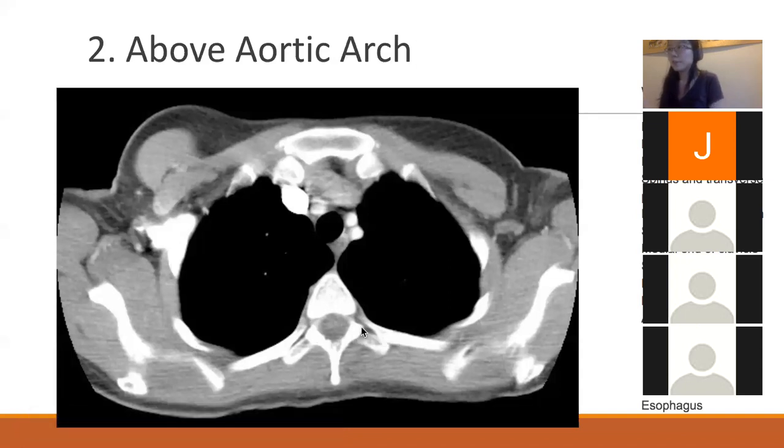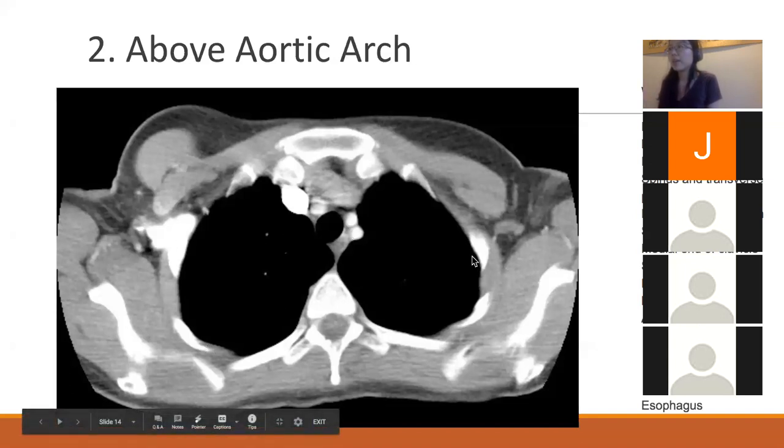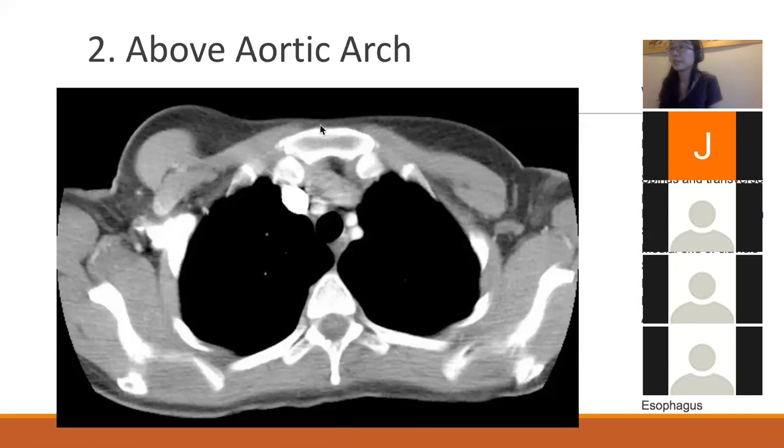As another review, I didn't mention this before, which is an oversight by me, but when you take CTs, structures with greater density are going to show up brighter. So the really bright structures are very dense, and those are going to be your bones, right? And then after that, you're going to have the muscle, which is a little bit denser than the fat or adipose tissue, which is here.